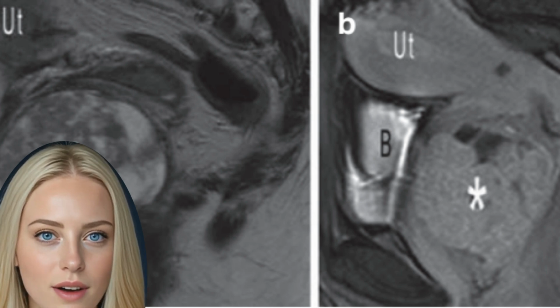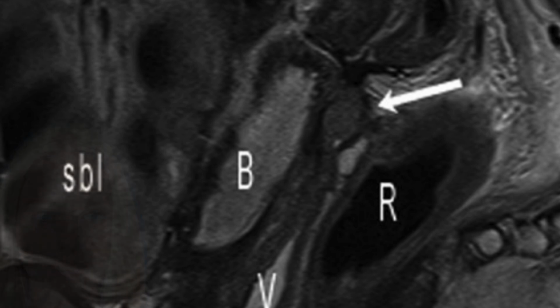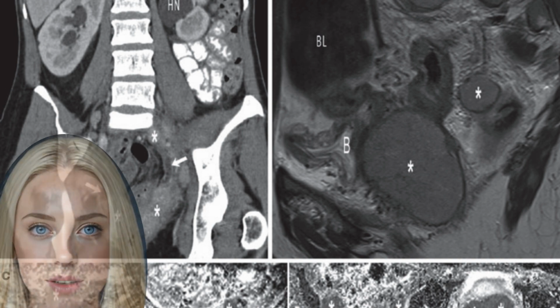Scar tissue as well as residual tumor tissue shows as moderately hyperintense in native T2WI. For differentiation, the CET1WI is used. Scar tissue is hypointense due to missing enhancement. Inflamed/tumorous tissue mostly absorbs contrast media and represents hyperintense. It is to be mentioned, however, that differentiation may be challenging in the first 6 months due to contrast enhancement of fibrous scar tissue.